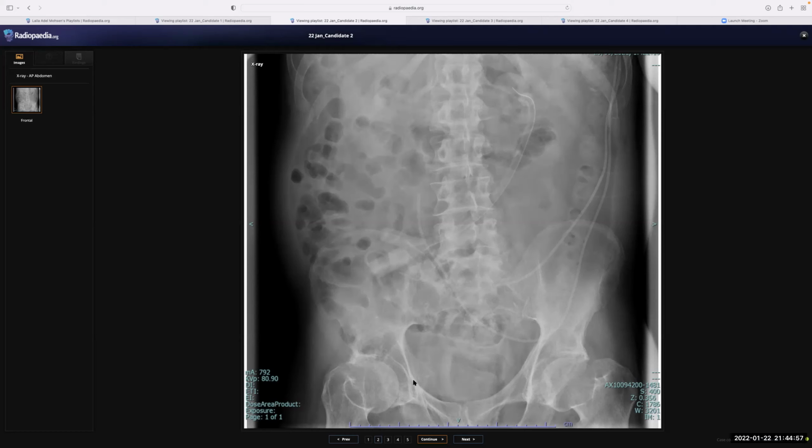Okay. So what would you recommend next? Because these are all positional, so you can just simply ignore them.